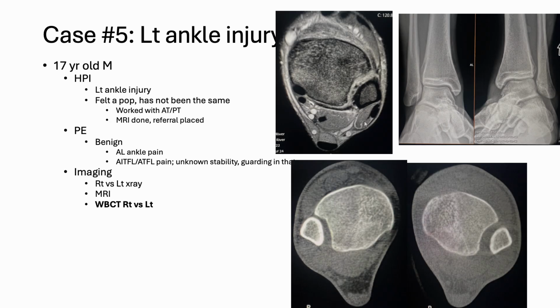Abnormal, normal. The left-hand side shows fibular rotation, with opening at the posterior joint and a smaller space anteriorly, so the syndesmotic area is closed down on the left, and the right side looks perfect. It looks exactly the way it should be, really showing that he had a significant injury. Likely he's getting subtle instability through his high and low ankle joints.